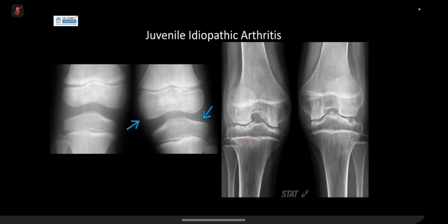To be fair, I think it's hard if you are just looking at symmetry, if you're looking at symmetrical both sides without one to compare, then in the absence of other symptoms and a purely isolated widened intercondylar notch, I think it's hard to pick up. Okay, and I often have to go back and compare it with age-matched controls to say, is it truly widened or is it just a projection thing?